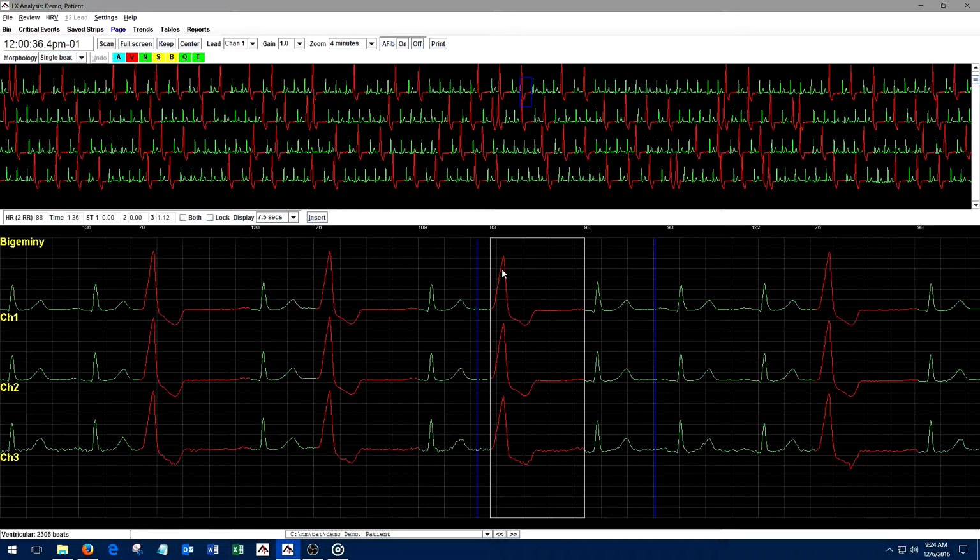All matches relabels the template to whatever label you choose. It is removed from its present bin and established as a template in its new morphology. All matches to that template have the new label.